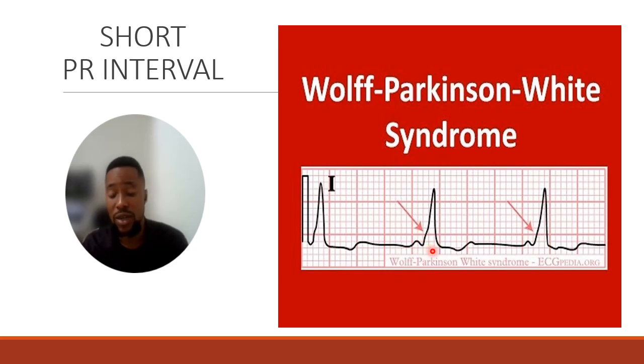Another condition where you can have this is also junctional rhythm. Definitely the P wave is inverted in junctional rhythm and there's no PR segment. So your PR interval will be short.